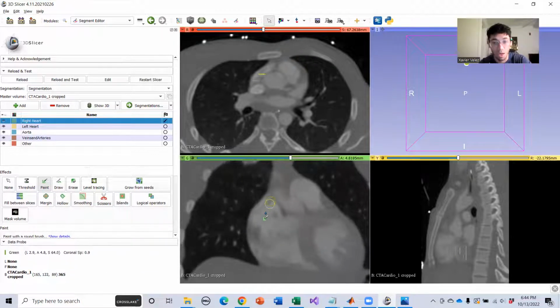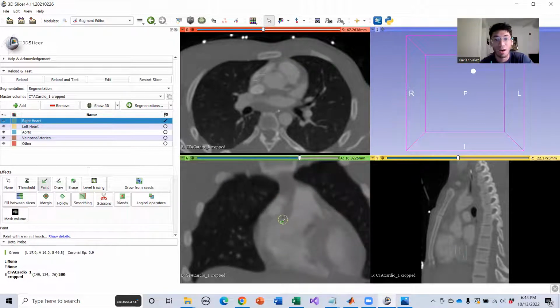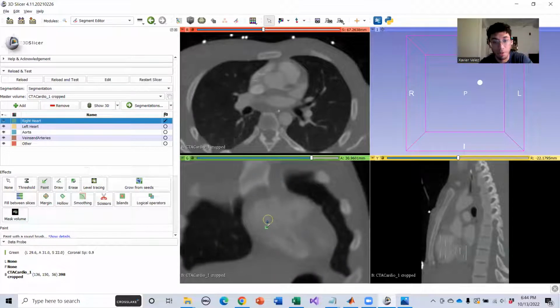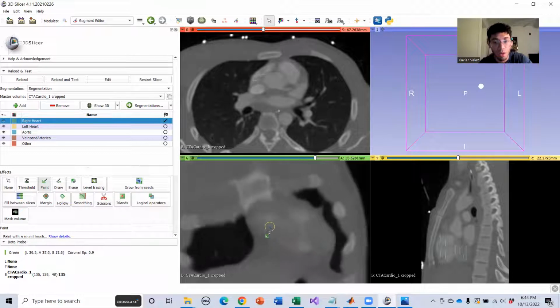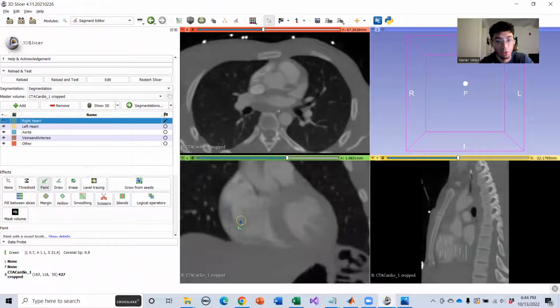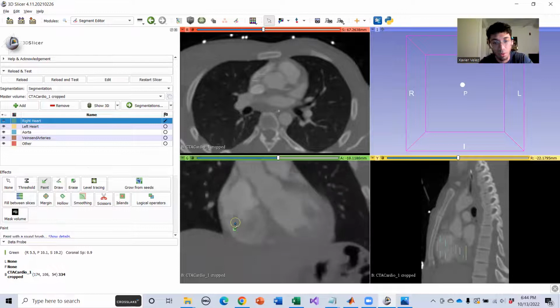But if it's not perfect, that's perfectly okay. Really the point is to get the general shape of where each component is. And if you end up segmenting something wrong, or if you miss a bunch of parts, there will be more than enough opportunity to fix that down the road. So I'm being pretty inaccurate here. I'm just going around dropping random lines wherever, maybe I'll add another one there.